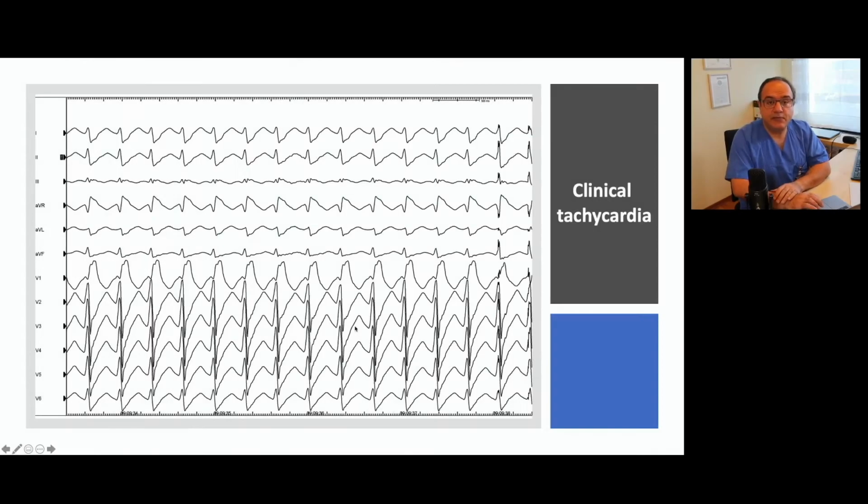Here we see together the ventricular tachycardia, or the wide QRS complex tachycardia, better to say. The wide QRS complex tachycardia, we see the right bundle branch block pattern. And now the question is, what is the underlying cause for this wide QRS complex tachycardia? What is the diagnosis? So the first clue comes when we compare the ECG with the sinus rhythm.